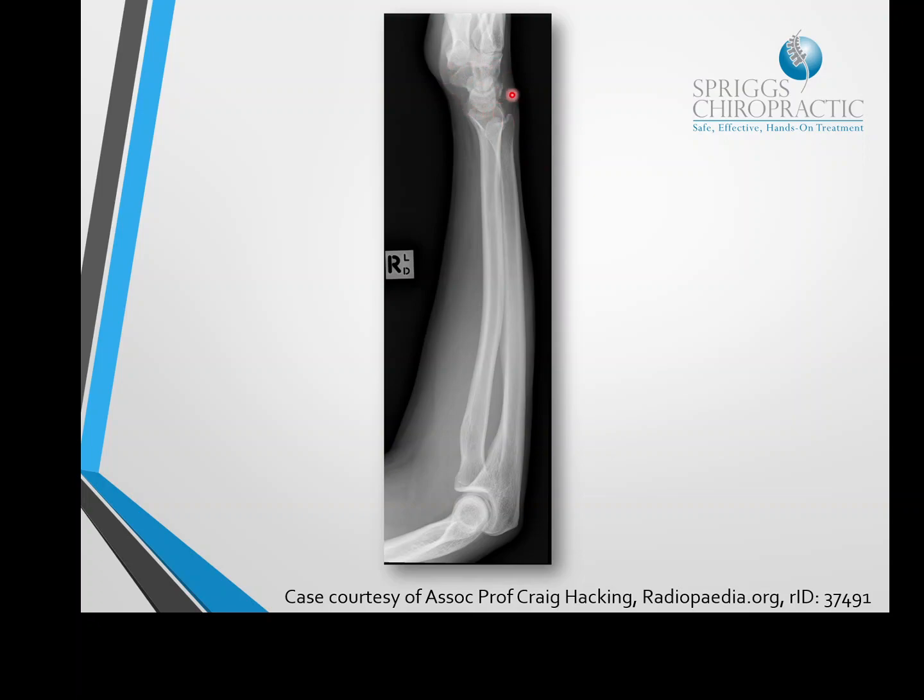So even with the divergence of the X-ray beam for a lateral forearm, you will still get that superimposition. But of course, you can see how the duck's neck is really long. So as a result of the divergence of the beam, this end and this end will be quite distorted because the X-ray central ray is somewhere obviously in the midpoint. So this is the true representation. These are distorted at either end.